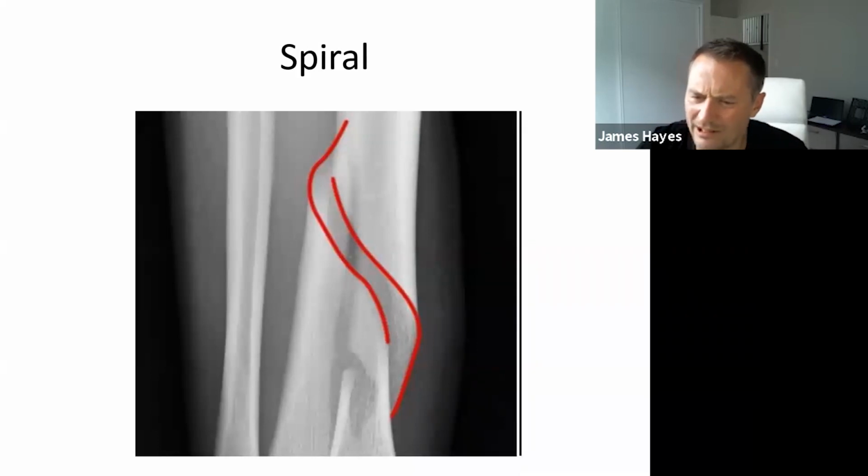Spiral fracture. These are quite nasty, or certainly can be, because you can leave that little bit in the middle hanging. Now, a lot of these in adults in the lower limb come from ski injuries. It's all perfectly normal because what happens is your skis stay straight down the hill, and as you accelerate, one of your feet gets slightly caught in the bindings as you are coming off, and your leg twists. You hear a funny crack, and then the next thing you know, you're in that sleeping bag being towed down the mountain by a very good skier.